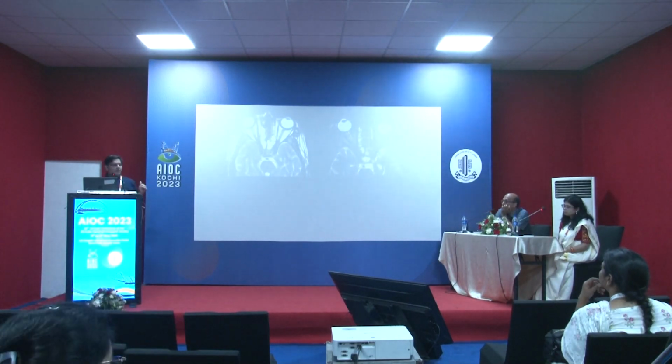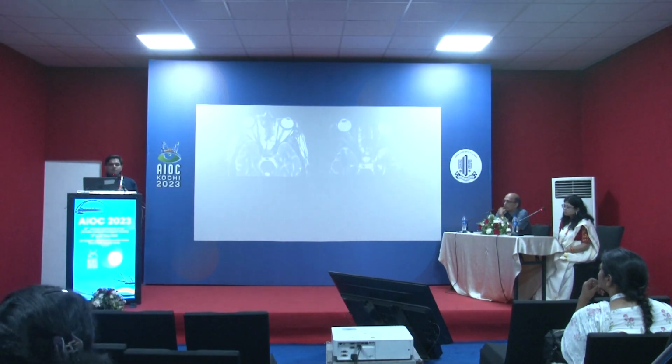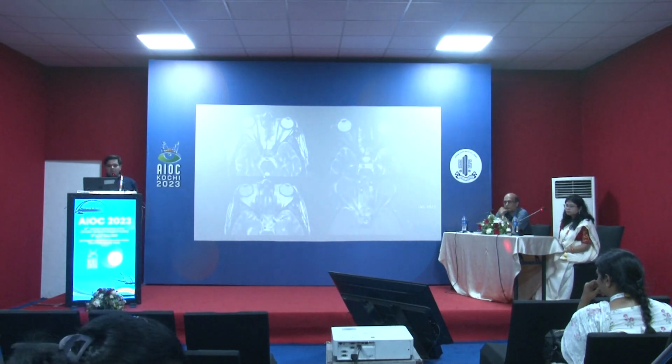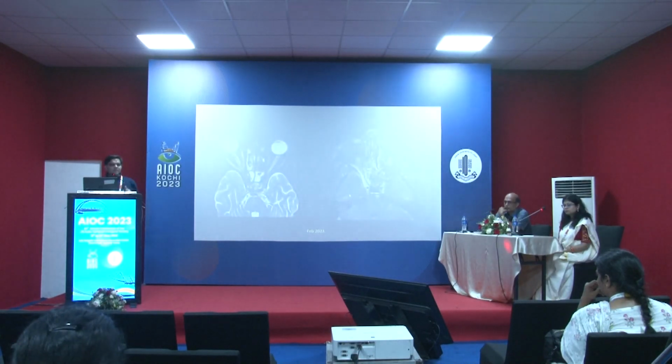Very often we find it very difficult to figure out if you have an early orbital apex syndrome versus early fungus. So usually we go by, is the sinus involved? In this, there was some sinusitis. So we did a biopsy. We got nothing. There was no fungus. They treated with steroids. And then 2 months later, it became worse. The amount of enhancement increased. The sinus became worse. They redid a biopsy and they got aspergillus.